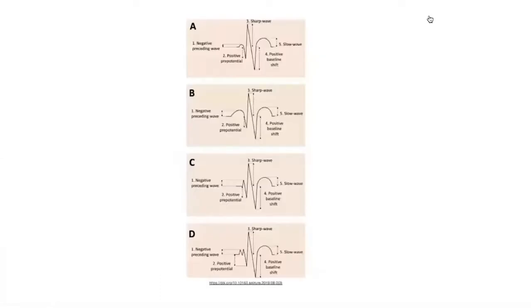The other fundamental is that we're looking at really shape as well as frequency and amplitude. So often when people begin looking at EEGs, they're thinking about the frequencies that are present, the oscillations of the waves, or how high amplitude they are in comparing, and think about this as some type of oscillation signal. But the shape of the wave is important. This is a tricky part as people begin learning to read EEG, because one has to get a sense of what these shapes look like.